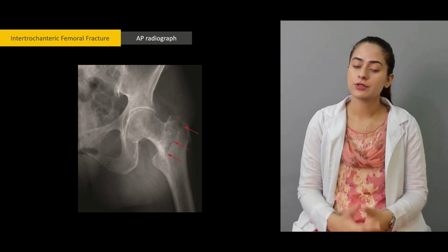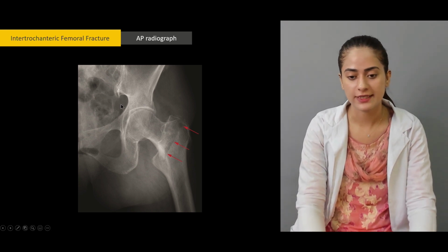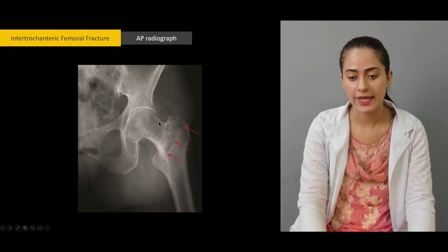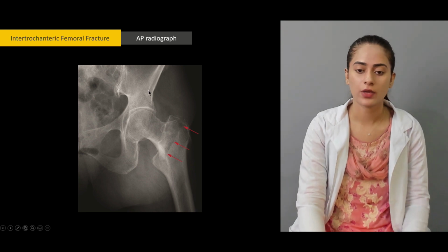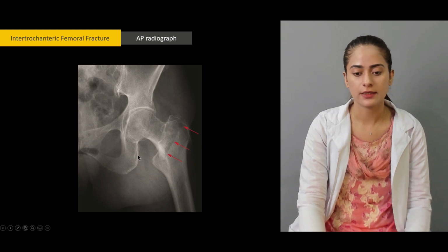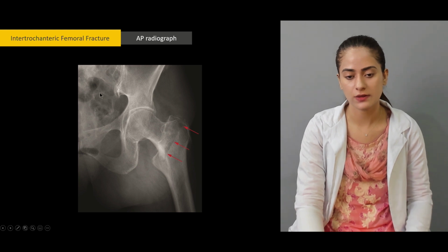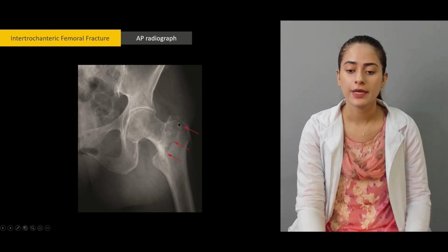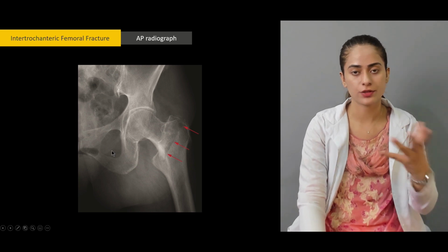So now we're going to talk about intertrochanteric. First, let's label it again. Acetabulum, femoral head, neck of femur, greater trochanter, lesser trochanter, the shaft of femur. This is going to form the ilium, and this is ischium and pubis here. Pubic symphysis isn't really visible. This is the sacral vertebral bodies. And coccyx moving forward, the fused ones are called coccyx.